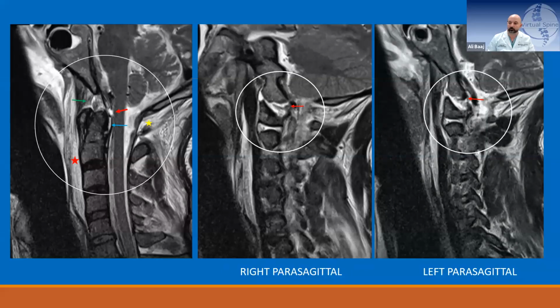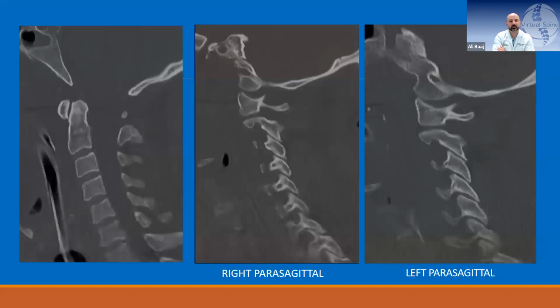Yeah, Peter, thanks for the case. If you go back to the CT scan, when we see a lot of these trauma cases, a couple things come to mind. You were talking, Peter, about all the ligaments. For me, AOD, or atlanto-occipital dislocation, is not very common. It's rare.